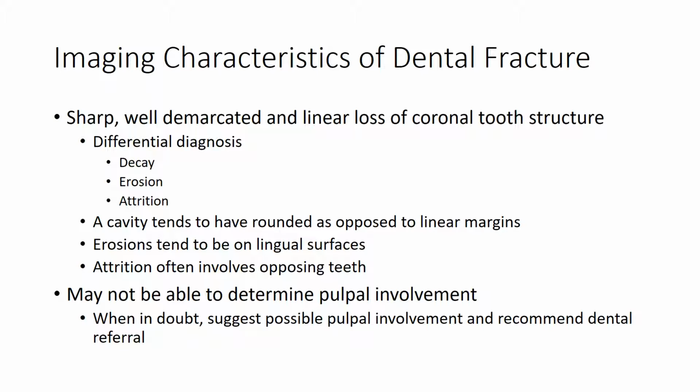You may not be able to see pulpal involvement, particularly on CT, but I would say when in doubt, just suggest the possibility of it and recommend dental referral.